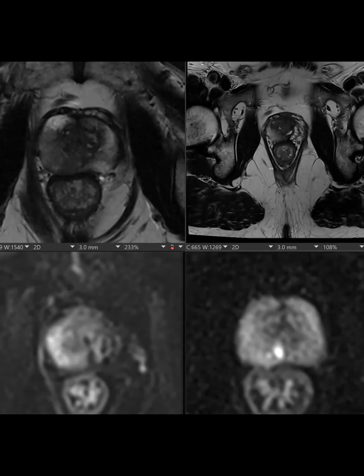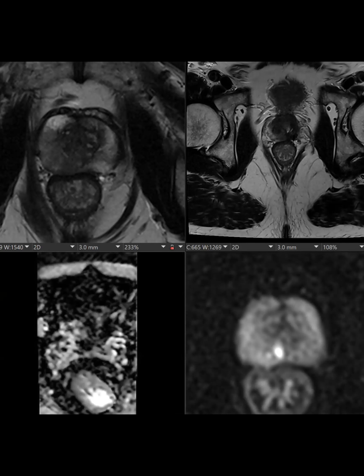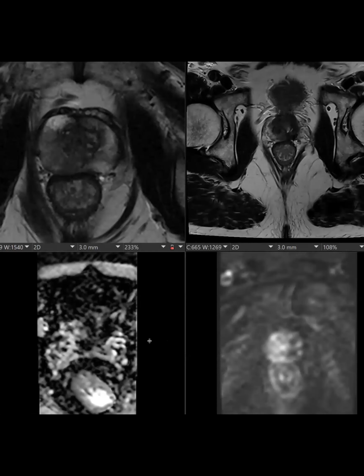or infection. And this was the follow-up. Gotten smaller, both the left apical thing and then the right. Some kind of inflammatory, infectious process. So this was prostatitis, and presumably granulomatous prostatitis because the patient was on BCG. So anyways, this is just another look. I think granulomatous prostatitis can have any look, to be honest. And then this was the follow-up diffusion, and then right here. Overall improving.